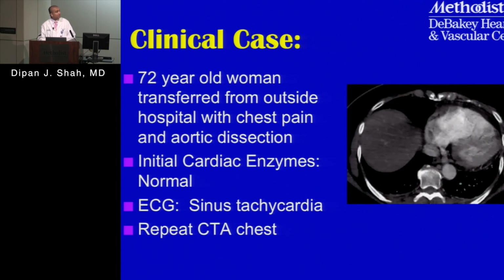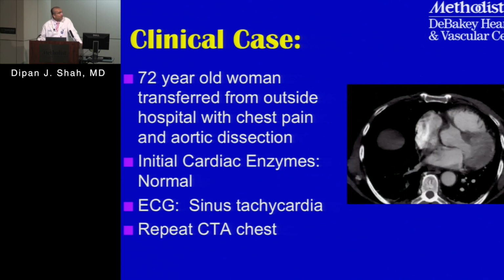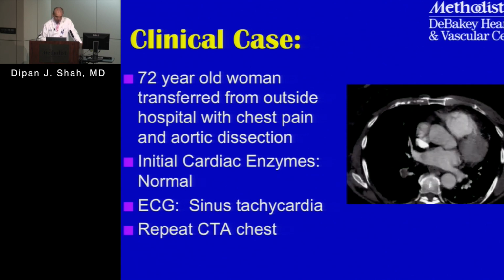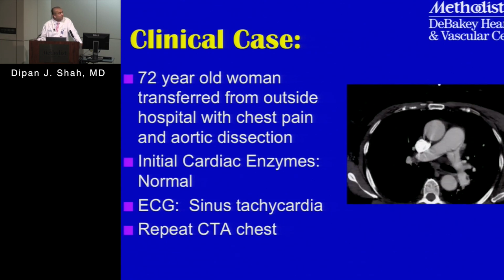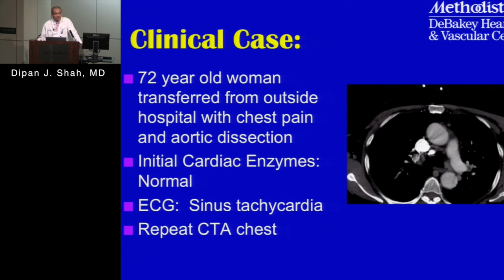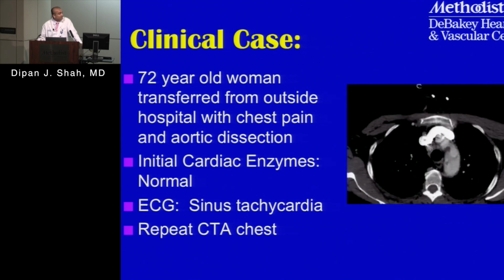Why don't we just take a minute or so and go through these series of axial slices and make note of what you see, because ultimately you're admitting this patient and we need to figure out how we're going to manage this patient and what other services you need to consult, if any.